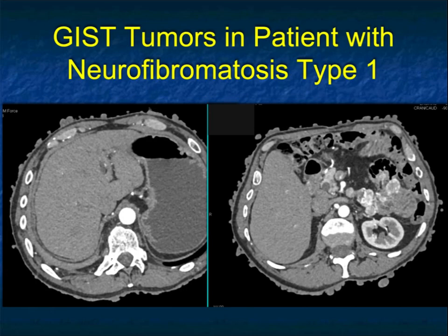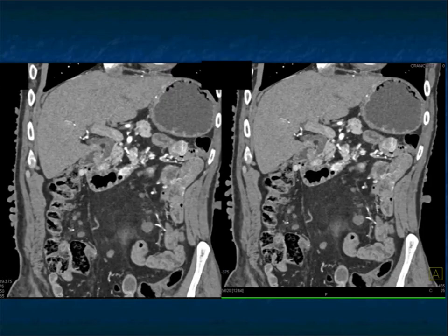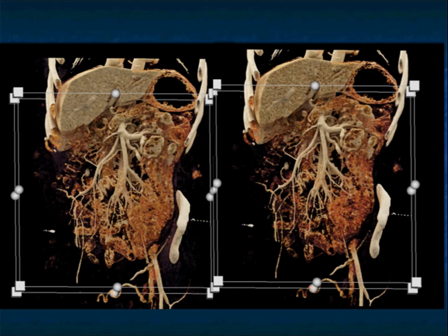Here's a great example. Look at the patient's skin, multiple neurofibromas. Then look at the patient's small bowel, an image on the right. Look at these multiple vascular lesions. These were multiple GIST tumors. So again, GIST tumors associated with neurofibromatosis type 1, and it can be multiple lesions. Just very impressive how you see the lesions are not causing obstruction, but it's because of the vascularity. If you see neurofibromatosis in a patient, make sure you look very carefully at the patient's small bowel.